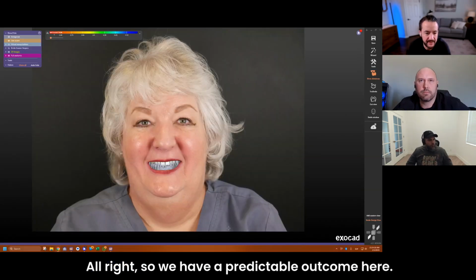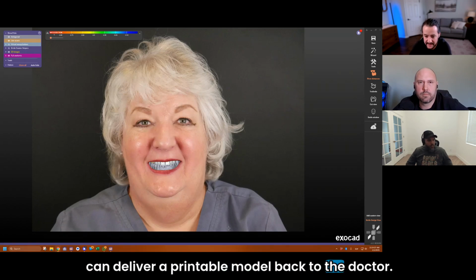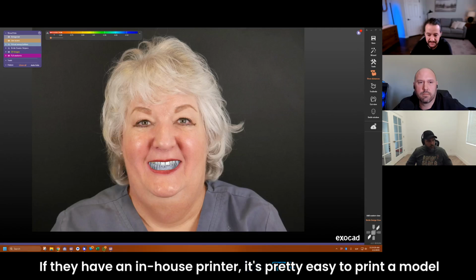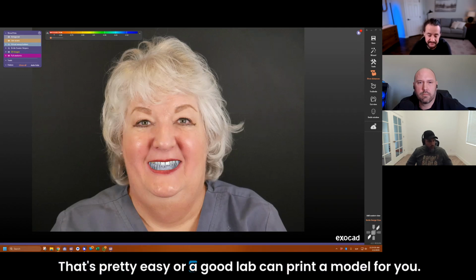All right, so we have the predictable outcome here now. We've done a 2D smile design, 3D mock-up. We can deliver a printable model back to the doctor if they have an in-house printer. It's pretty easy to print a model and do a putty matrix to be able to do 3D mock-ups. That's pretty easy, or a good lab can print a model for you.